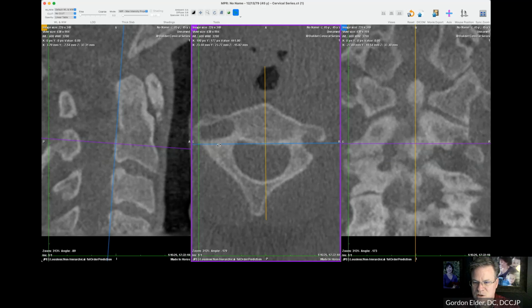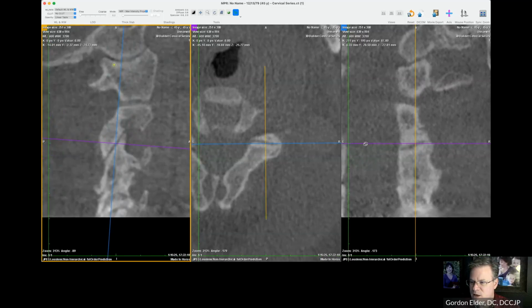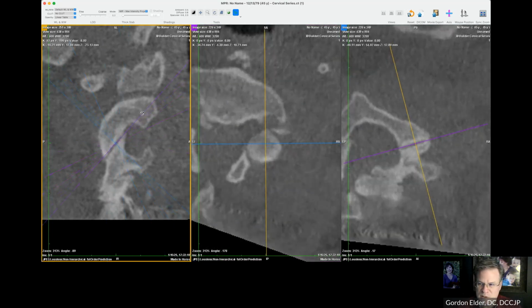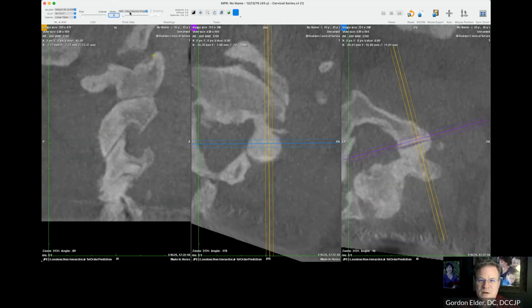So now I'm thinking, okay, let's go look. We looked at the left. That was a mess. Let's see if it's gone posterior on the right. And since we've got a minute or two left, let's go ahead and do that. There's a little bit of tropism there, right along the joint. Let's see, was it this one? There we go. Okay, let's get rid of that so we can see. Now you notice I'm at 0.3. So let's get that to 3 millimeters. Get it out of this other mode.